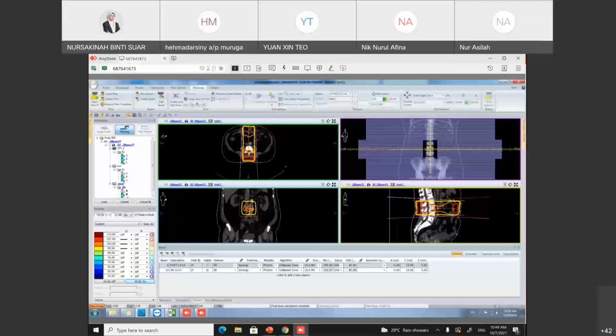So we will just accept this plan and continue treatment. But if this patient is, for example, example 3 and example 4, you will need more specific coverage, meaning the 95% coverage at the target area. So far, that is the question for this example case, actually I'm already done for this case. Any questions?